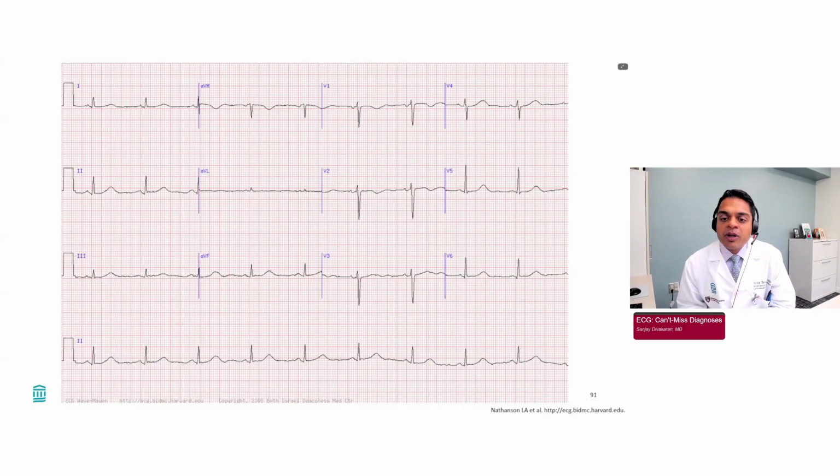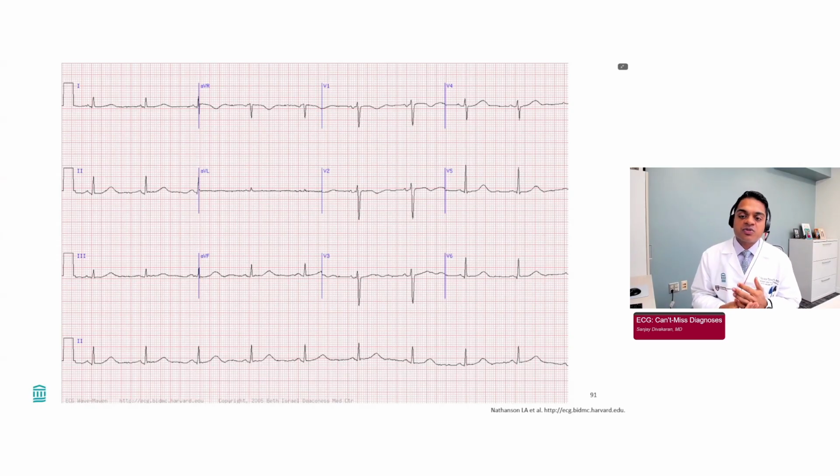So what I want to go through is what are practical recommendations for QTC, right? This is a common occurrence on the hospital medicine service, which are patients who might have a prolonged QTC. You're thinking about an antibiotic or an antipsychotic or other medicines, and who's really at risk for developing torsade.